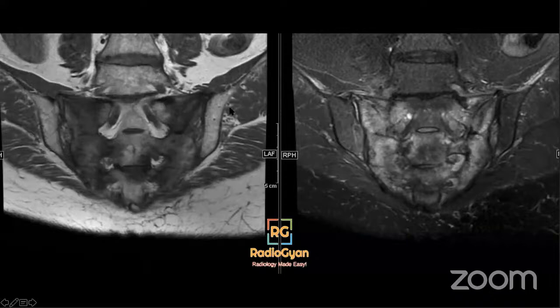The iliac aspect is pristine. So in a joint pathology, we would expect changes on either side of the joint, but that's a good thought for sure. The diagnosis in this case is sacral insufficiency fractures. Again, normal stress on a weak bone gives rise to insufficiency fractures.